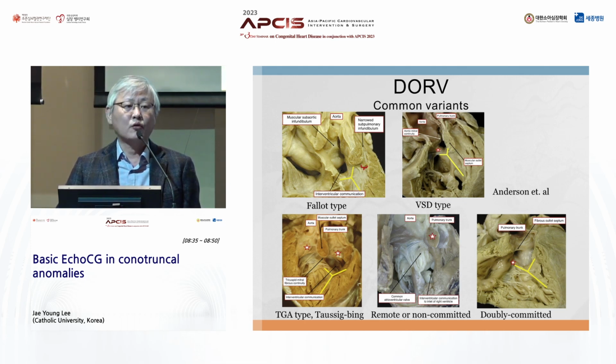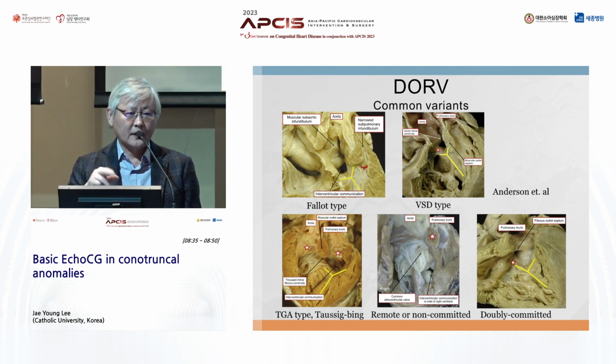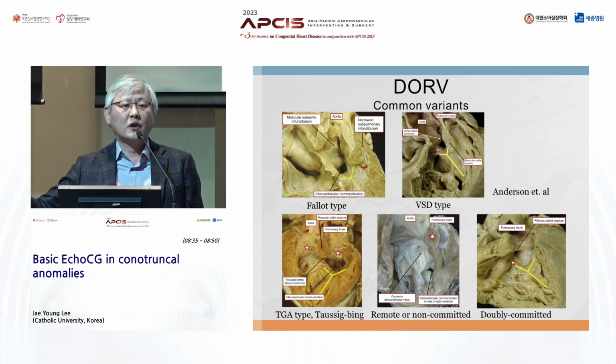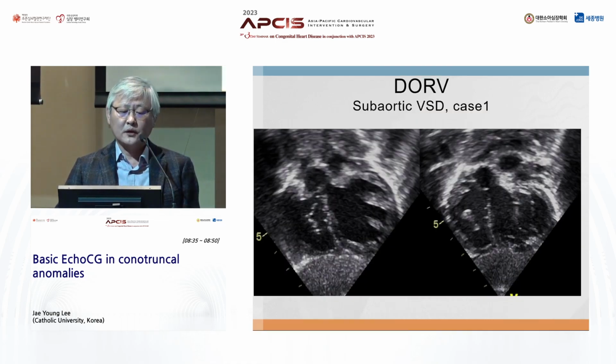And this is the remote or non-committed VSD. Typically, the inlet VSD with AV valve override, or the muscular trabecular VSD, is the remote or non-committed VSD, and the other type is doubly committed.